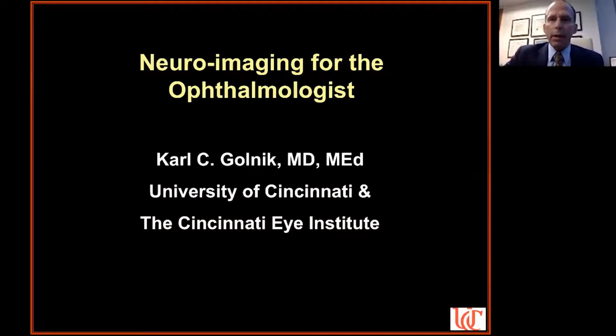This is my first webinar of the year, and we decided on a topic, neuroimaging for the ophthalmologist. So I'm hoping to show you lots and lots of neuroimages and try to cover some of the more common things that we see in ophthalmology, at least from a neuroimaging standpoint.